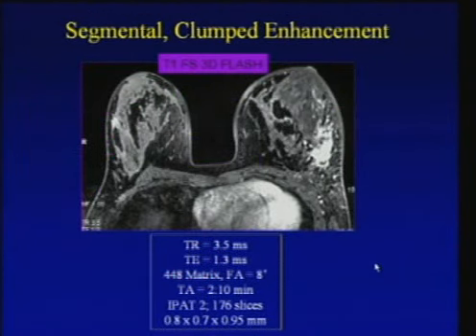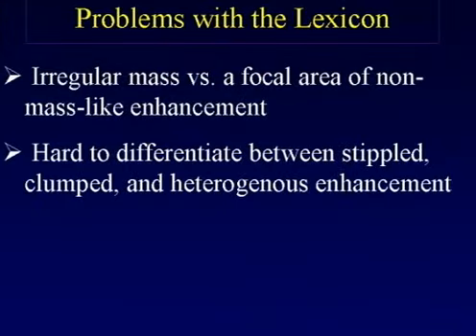And again, if you have segmental clumped enhancement, known cancer, but I think here you can really appreciate these ductal areas of enhancement. Clumpy, one really does not look like the other, and all of these are our high-res images being performed on a 3T.